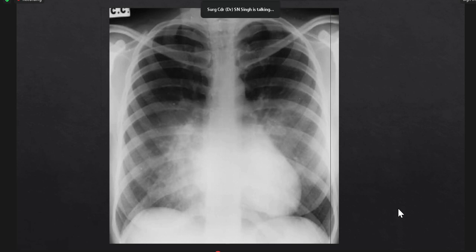Now I was not interested in that second DD, so I have gone to the third DD. The indication is that that is not the answer. As if you have to decipher from examiners. Okay, what is the second? Okay, now tell me the third one. That means the second thing is not the answer. What do you think next?